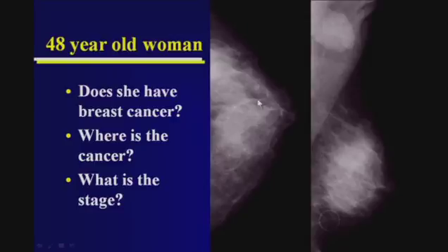It's a dense mammogram. But if we look above the line, we can see that there's more density above the line than below the line. Also, if we look here in the outer part of the breast, there's more density than the inner part of the breast. Furthermore, we know that we probably didn't get as much posterior tissue on the CC view as we'd like, but we're thinking that probably the lesion is upper outer. And note this markedly enlarged axillary lymph node. So with that large lymph node, we're thinking either the patient has breast cancer with axillary metastasis or perhaps lymphoma. So we're going to primarily try to look in the upper outer aspect of the breast.